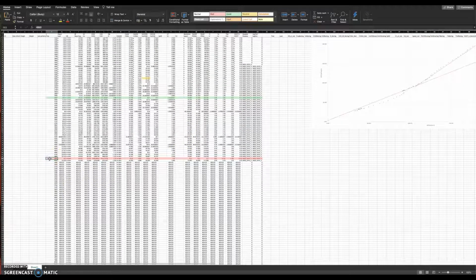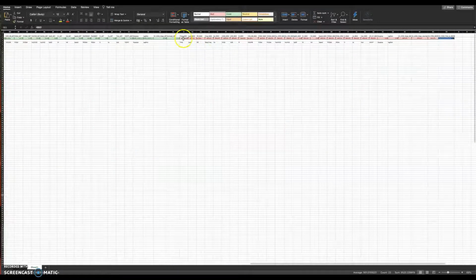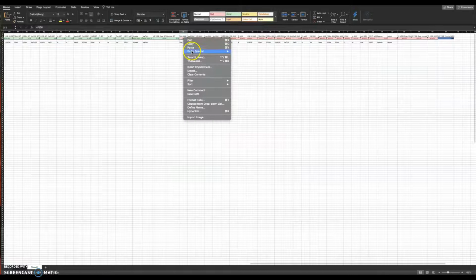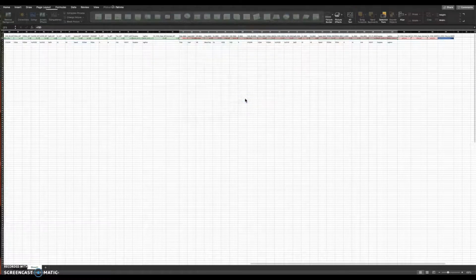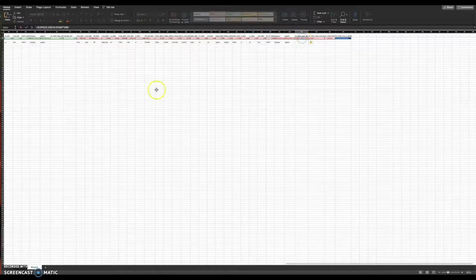And then finally we need our max data. So again, copy this, take a note of that, 83. Right click, control, paste special, paste link. And then we have to do the same thing here, only this time we're going up to the max point. Remember that was 83.